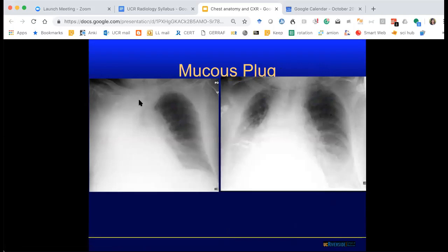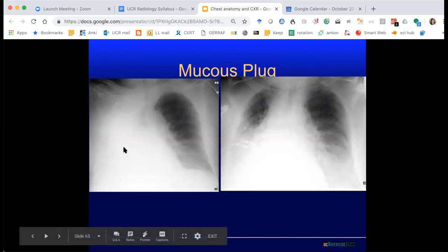Towards the right. Yeah, so here is the heart. Here's the midline of this patient. So normally the heart should live here, but the heart as well as the mediastinum is shifting towards the right side, the ipsilateral side of the collapse. And then what else do you notice about the left lung? You have hyperinflation. So these findings suggest that there's volume loss.